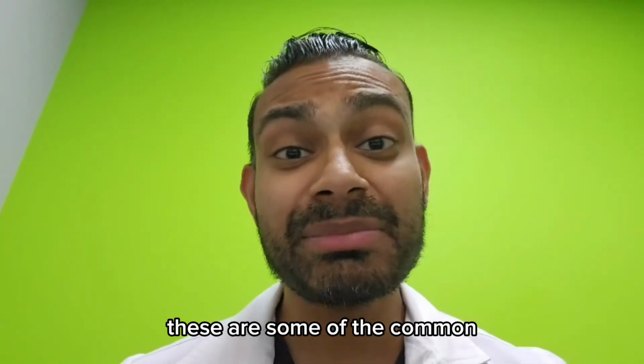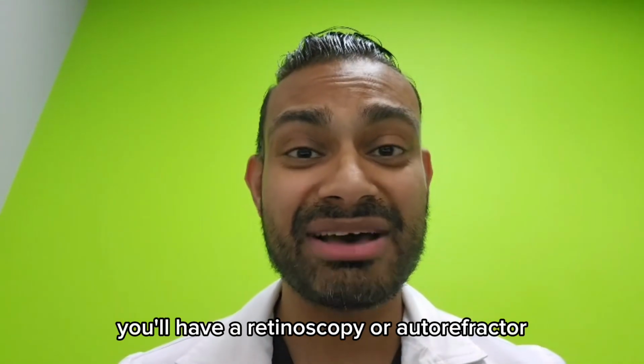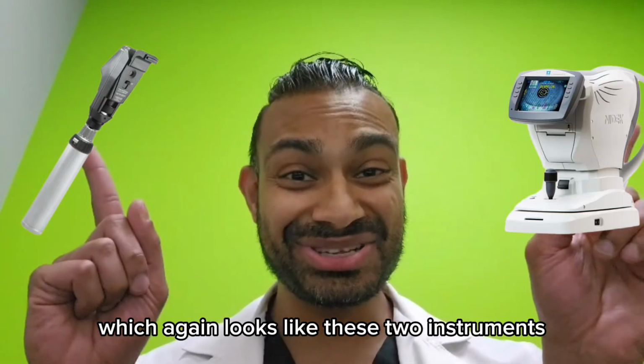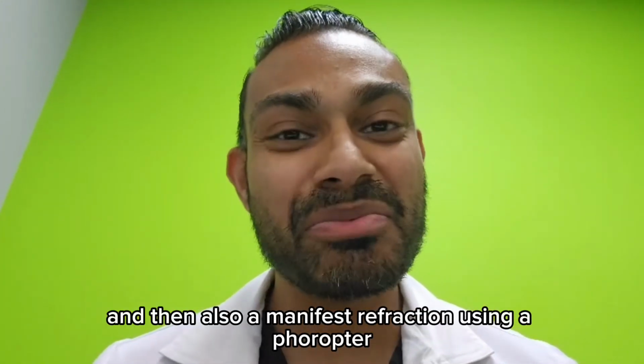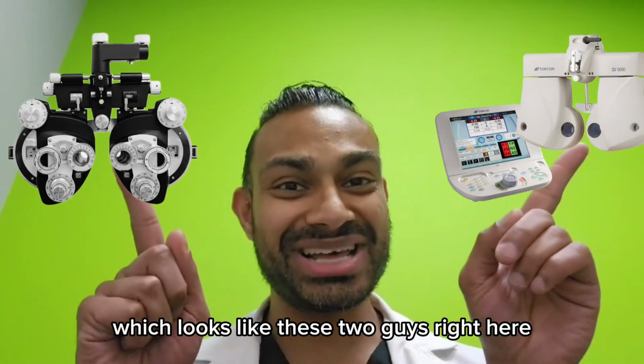So these are some of the common things that you can expect at an initial Ortho-K consultation. You'll have a retinoscopy or autorefractor done, which again looks like these two instruments. You'll also have a corneal topography done, which looks like that. And then also a manifest refraction using a phoropter, which looks like these two guys right here.